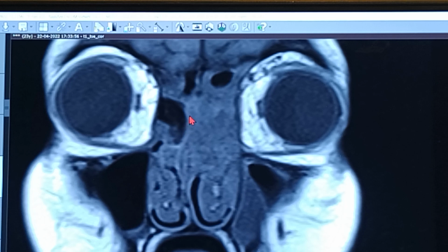The second thing you can see over here is that the septum on the patient's left is being pushed onto the patient's right. That is the septum outline. You can still not see black shadow over here because this is still the septal cartilage. And you can see this is the maxillary attachment. That is a black color. That is septal bone, the maxillary crest bone. So this is still cartilage, and you can see somewhat of an indentation happening over here towards the right side.